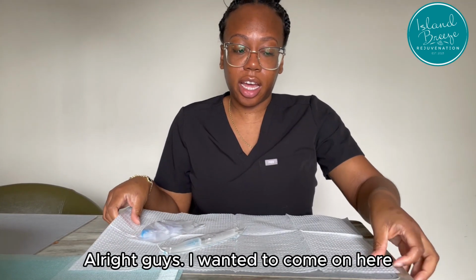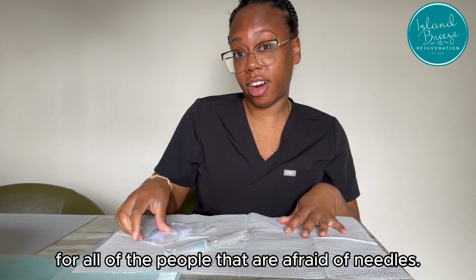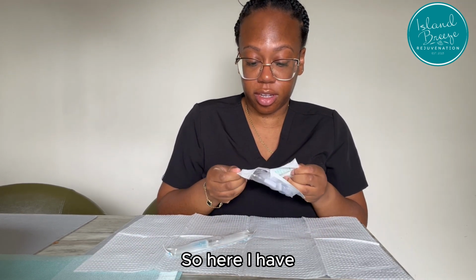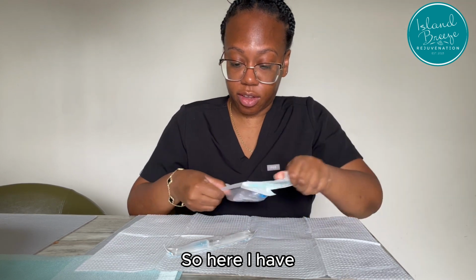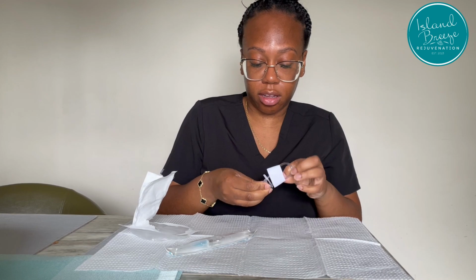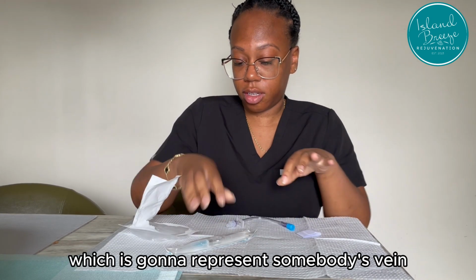Alright guys, I wanted to come on here for all of the people that are afraid of needles. So here I have a piece of some IV tubing, which is gonna represent somebody's vein.